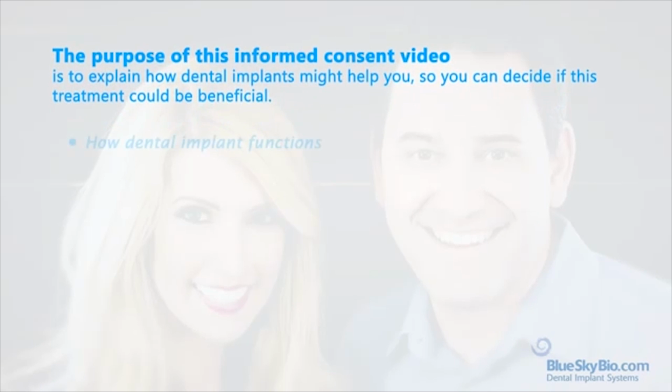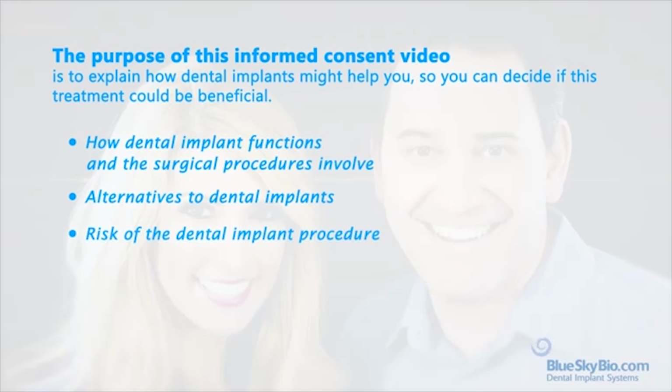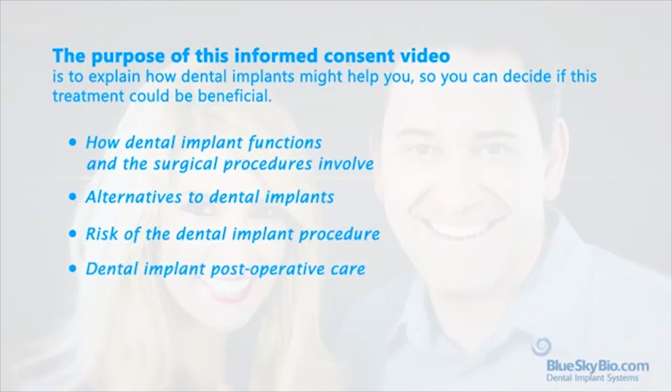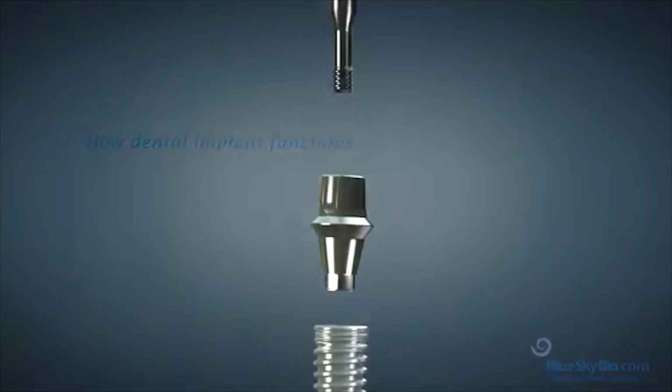During the next few minutes, we will explain how a dental implant works, the surgical procedures involved, as well as the alternatives to dental implants. No surgery is completely risk-free, so we will look at potential risks as well as the procedure for looking after your dental implants immediately after surgery. We'll begin with explaining how a dental implant functions.